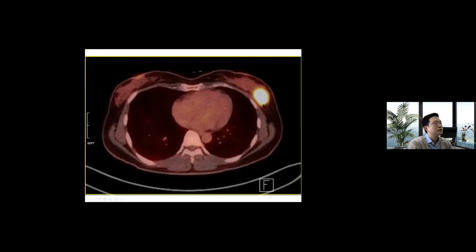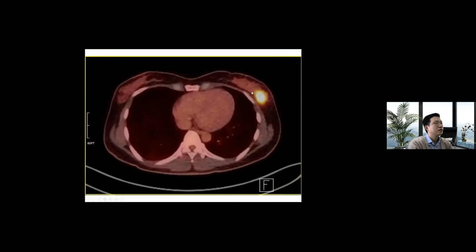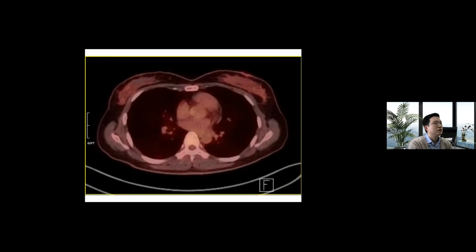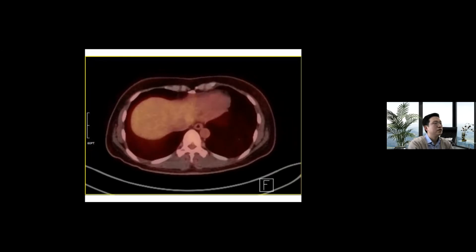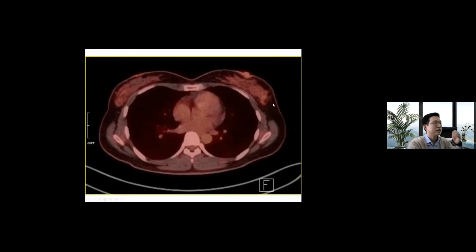It's attached to the chest wall, but it's not our responsibility to call any chest wall invasion or not. You can just check the whole breast to see if there is another focal lesion for the primary tumor, and there is nothing like that.